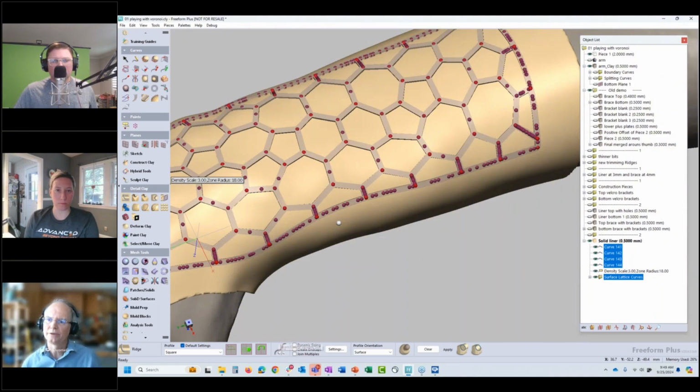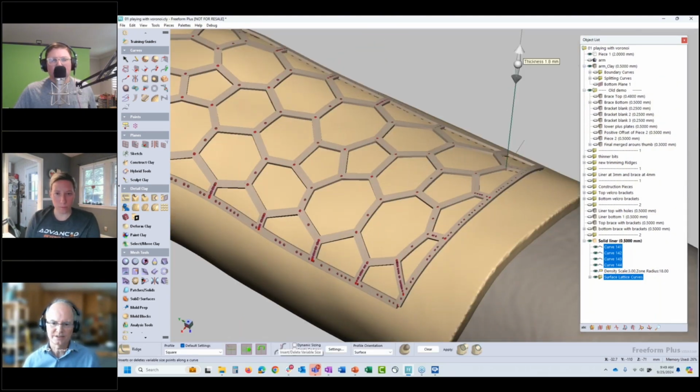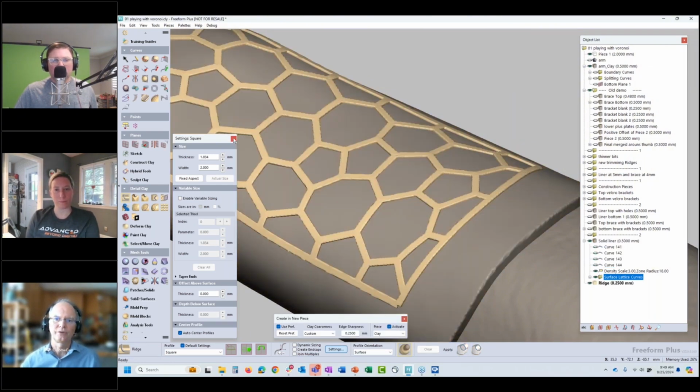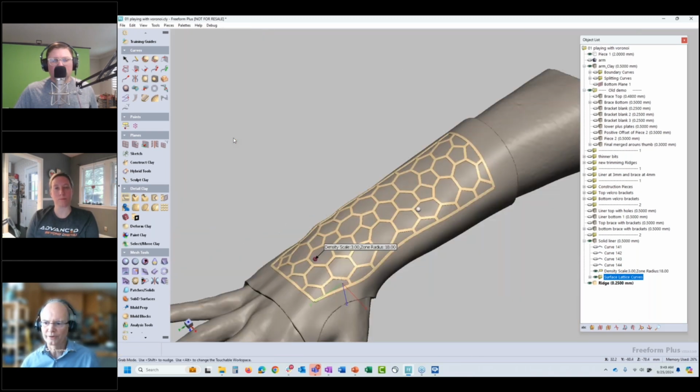And then with dynamic control, you can always change the size of these in real time, or you can type in the numbers. You know, the numbers are super important. Again, bring up the settings. And then you can easily just accept that in. Ooh, let's hide the settings box. So there we have a Voronoi net. So that's one of the new tools that's coming.